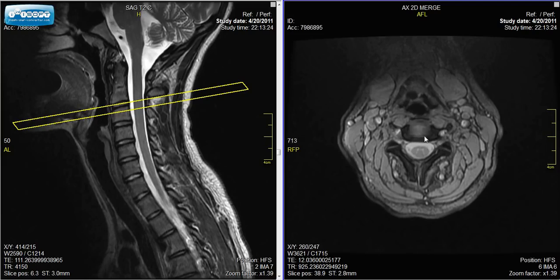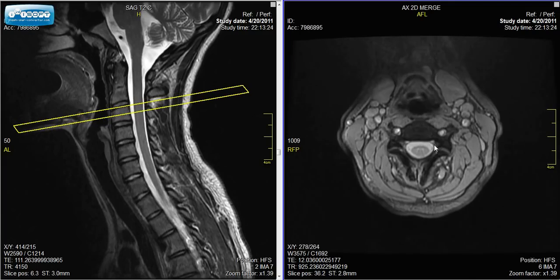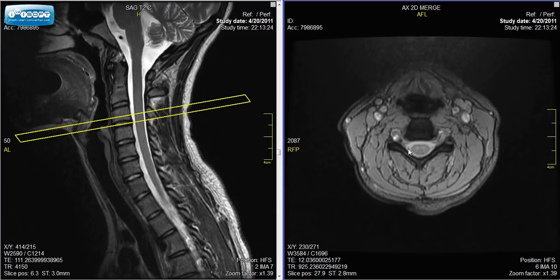Now, one other difference between the cervical spine and the lumbar spine is that the nerve roots here basically exit straight out at the same level. Remember, in the lumbar spine, these nerve roots first travel up into this corner and then wrap around the pedicle and go out into the foramen. So they're not going straight out, but in the cervical spine they do, and we can kind of see that even in these lines here of the nerves. So at every level we can see the nerves here. In fact, you can even see that there are two of them. There's a dorsal and a ventral root that then combine within the foramen.